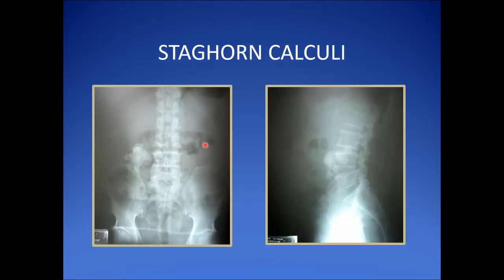So here is an example of an abnormal KUB. If you compare right and left, one could see this irregularly shaped calcific density at the right lumbar region. It actually forms the cast of the pelvocalyceal complex on the right side. On the lateral view, one could see these calcifications overlying the lumbar spine, so I know that this is a retroperitoneally located calcification. This stands for staghorn calculi.